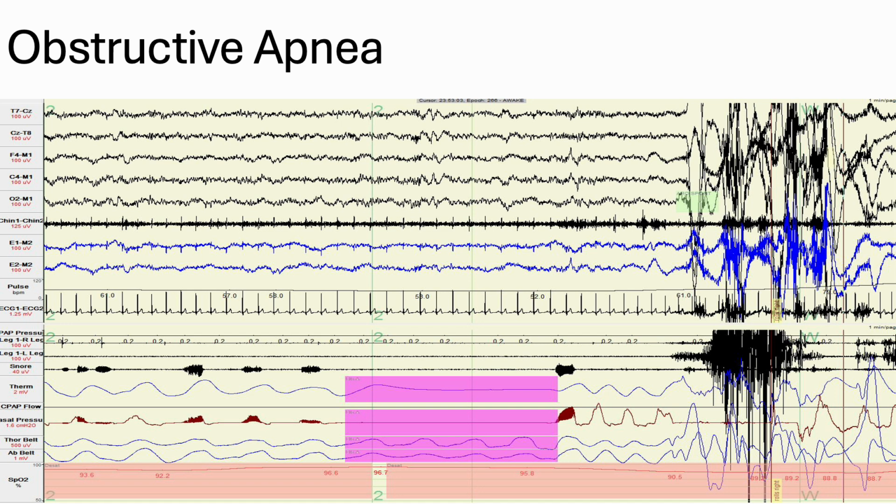Let's look at the purple shaded box right there. Above it, it looks like non-REM. Lots of chin tone. I don't see eye movements, but this isn't a lot of alpha or PDR. And there might be a K complex, maybe.